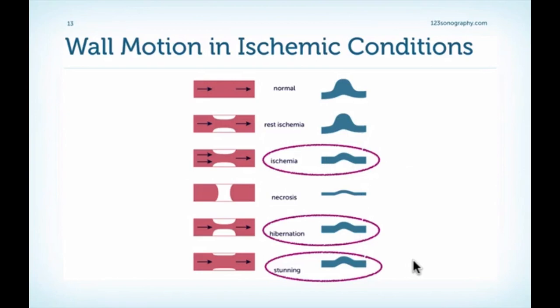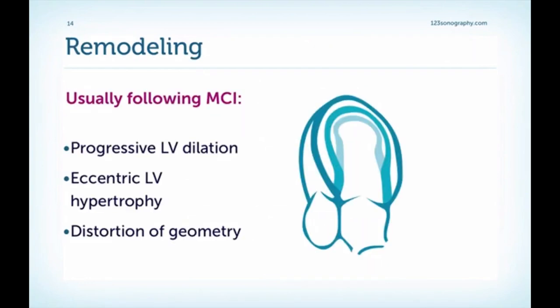However, we can look at additional clinical findings and thereby elucidate what the problem must be. There are certainly other methods also in echocardiography with which we can differentiate these, for example with the help of dobutamine stress echocardiography. I would now like to introduce you to another very important concept, the concept of remodeling.